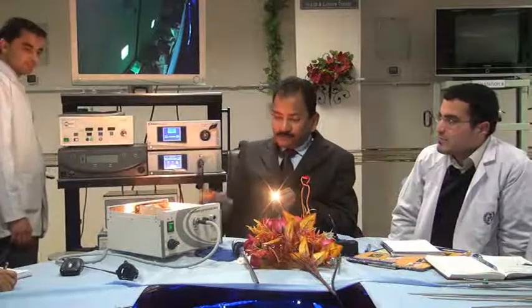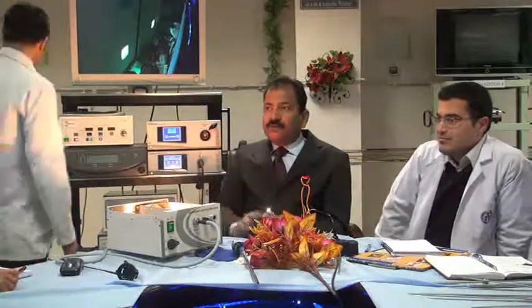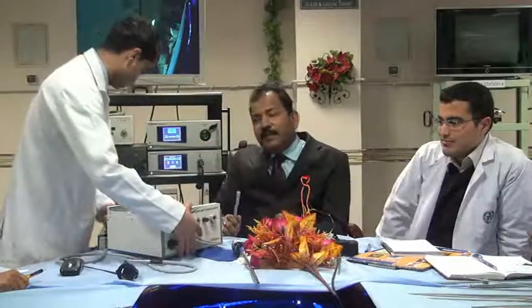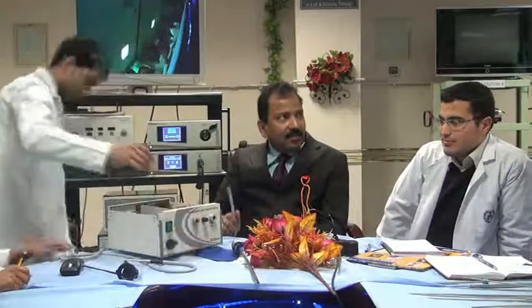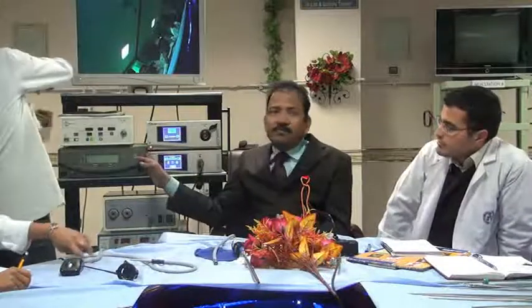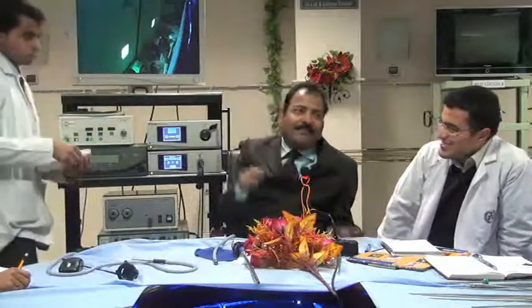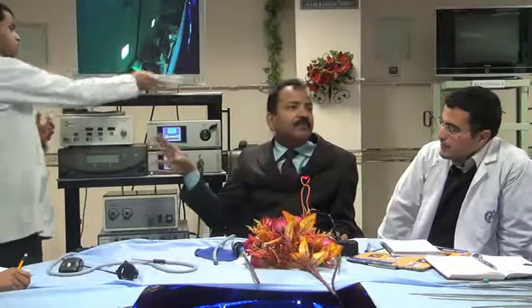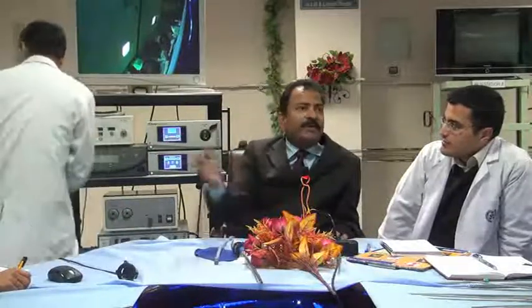What is it? Halogen or xenon? This is halogen, this is LED, you have xenon. But LED nowadays is better. And if the light source has a good heat sink and good fan exhaust, remember, some people want to protect their laparoscopic instruments, so they make a beautiful cupboard with a glass shutter and put all the instruments inside. Don't do it. It will suffocate the instruments. Instruments must be open from all around for proper exhaust. Air vents should be there.